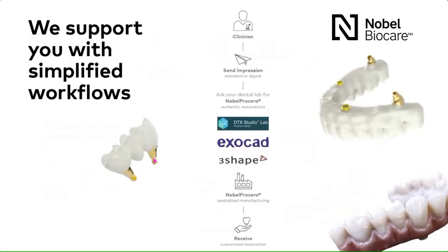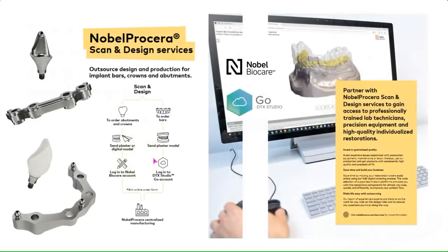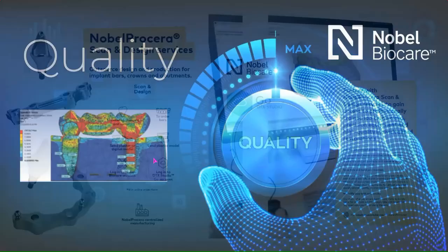easily. We do have different avenues to reach us at NobelProcera, where you can send us your custom designs, of course, through our DTX Studio Lab software, our native exocad dental CAD software, which we're going to be showing here in just a few moments. And of course, we do have access to 3Shape as well, where you can directly send us these files. We also have our NobelProcera scan and design services. So if you're not utilizing exocad, 3Shape, or our DTX Studio Lab software, you do have the ability to send cases to us for certain products where we'll be able to provide scan and design services there as well.